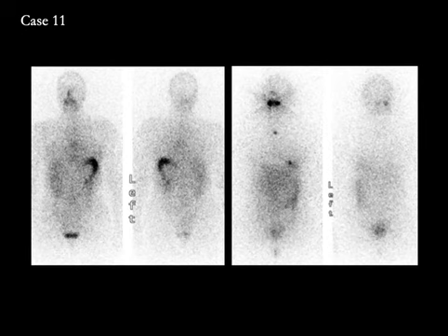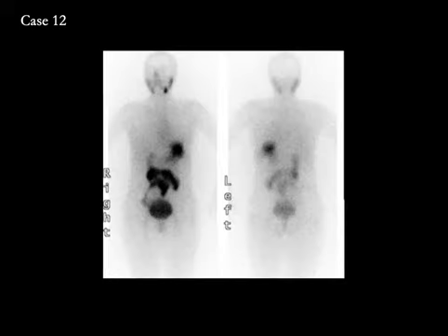Another scan with similar clinical history where the initial study was negative, but after treatment, 2 foci of increased uptake are seen. This is in the thyroidectomy bed. This is likely a focus in one of the anteriorly located ribs, consistent with bone metastases. This patient has metastatic differentiated thyroid cancer involving a left-sided submandibular lymph node seen here on the anterior image.